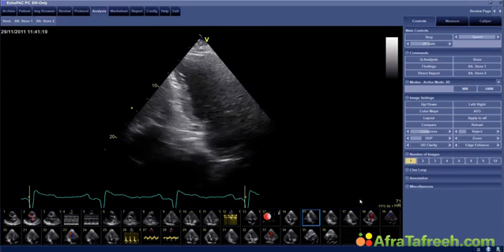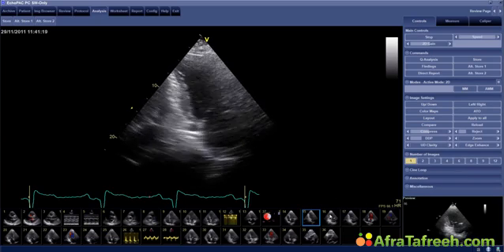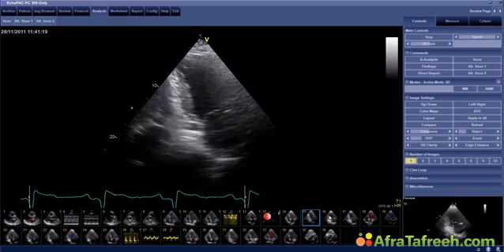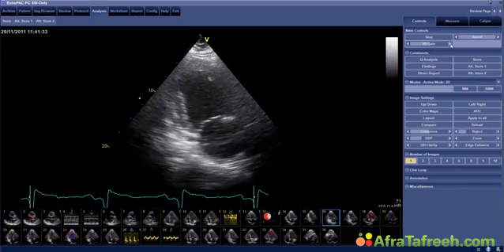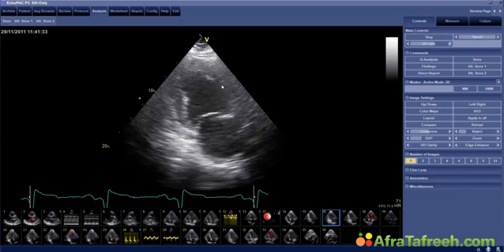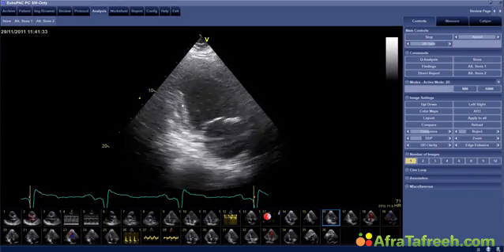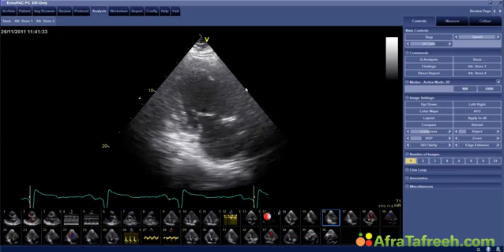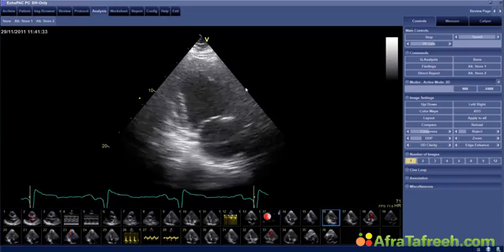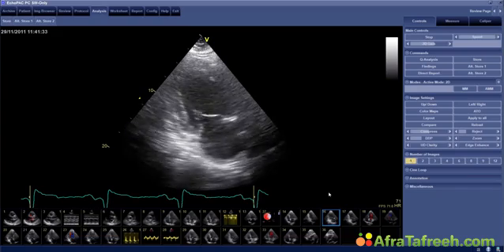And then we have to look very, very closely also at the anterior wall and look at the regions, especially at things like hinge points, thickness of the myocardium, and move the transducer in all directions to really get an eye on these regional wall motion abnormalities. So this was certainly a very difficult case, but I think a case which very nicely illustrates that regional wall motion abnormalities are very difficult to interpret.